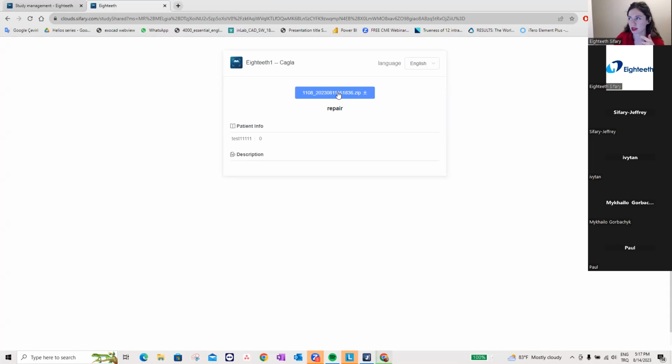You see, it's now on the right picture. You see, there's uploading, and it's so easy. So we don't need to share via something like WeTransfer.com, because these STL files are mostly around 40 megabytes, something like that, and mostly don't fit our email folders, but it's a very easy way to share a download link.